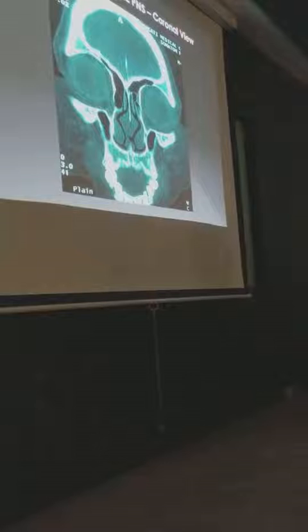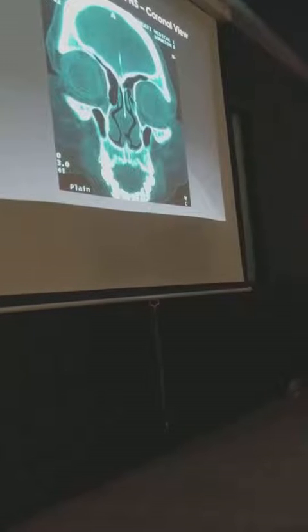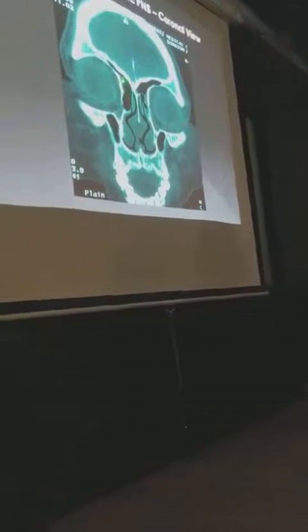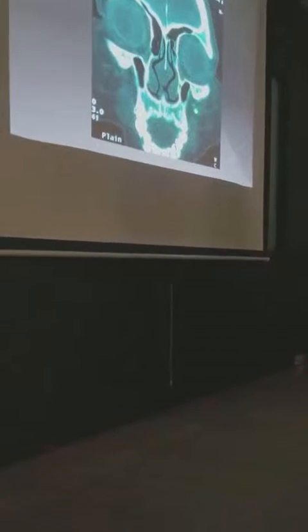So next slide, please. So you see the big jump from that area to this one, because it's a variable slice thickness, because we want to concentrate on the all-important osteomeatal complex. So if you see here now, let's look at the obvious ones first. You see the orbit, okay.